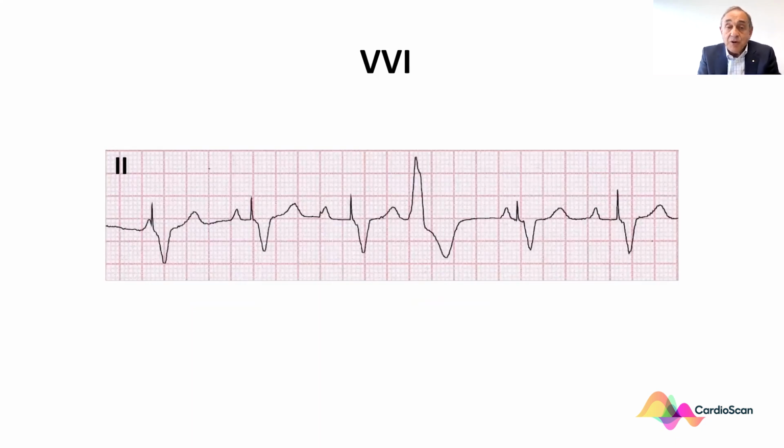Here is another example which causes a lot of confusion. Here we can see the paced beats with the red arrows. There is a ventricular ectopic present, and there is inhibition of the next output. But there are P waves present. And one must remember that we have only a single lead. We cannot sense what is going on in the atrium, and therefore this is not malfunction, in that the sinus P waves play no role in the sensing of the ventricular pacemaker.